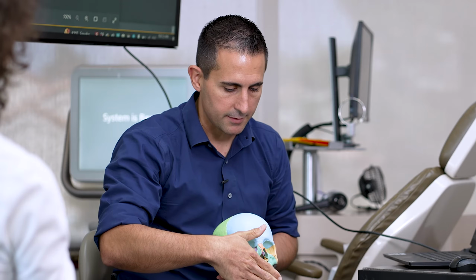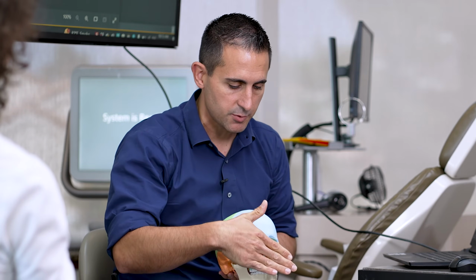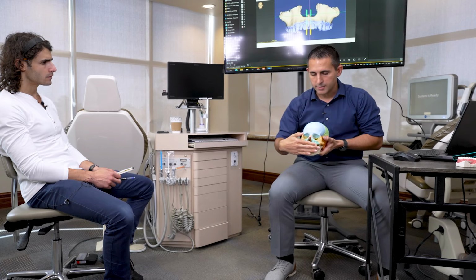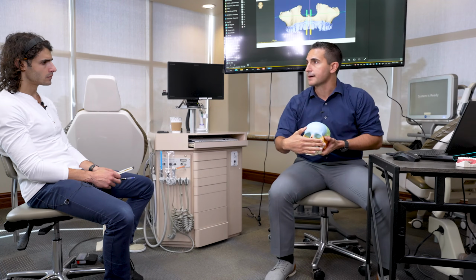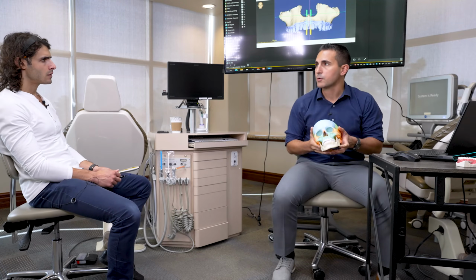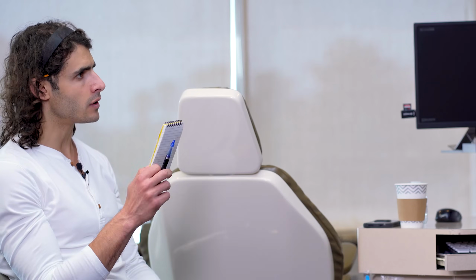Well, when you go to expand, if you could do something that levels that out, meaning change the forces. So instead of just placing it on the jaw the way the jaw is crooked this way, change the force so that the screw is going this way, then you can actually start to move this side up more, this side down more, and start to level the jaw as it's expanding. So that's the direction that they're going. They want to be able to do that predictably. That's what you meant when you said three-dimensional expansion. Correct. You want to make sure that in all three dimensions, it's controlled.